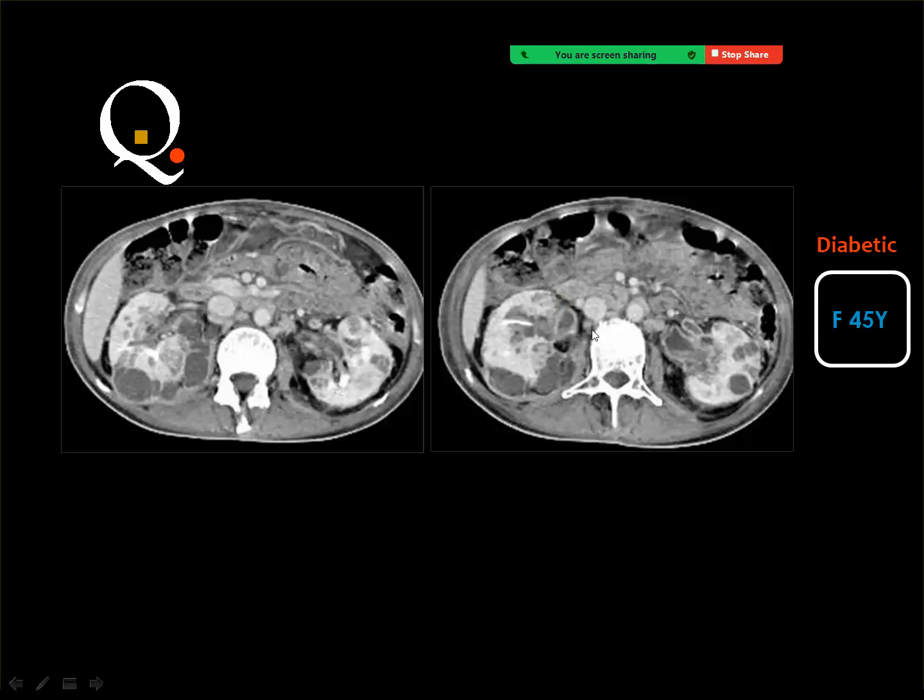The xanthogranulomatous pyelonephritis is usually unilateral pathology, and the kidney is not functioning. The kidney is enlarged, and most of the kidney may be replaced by fat, and there should be a big stone in the renal pelvis.